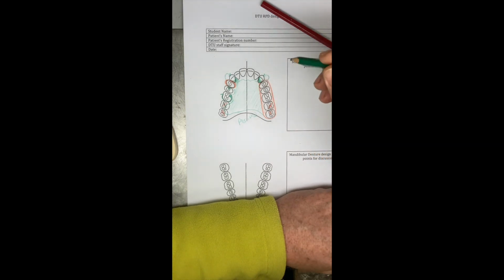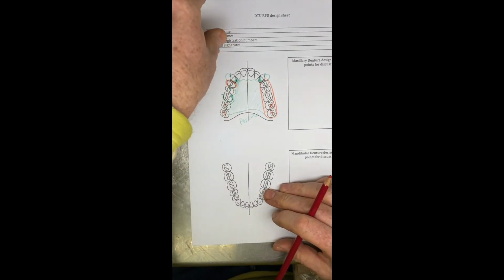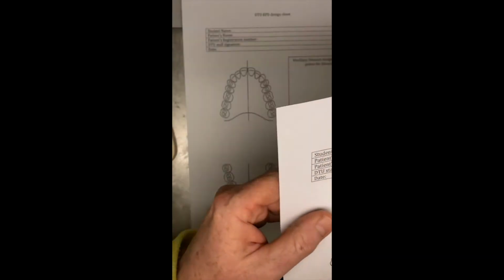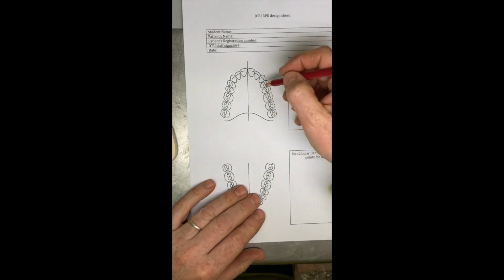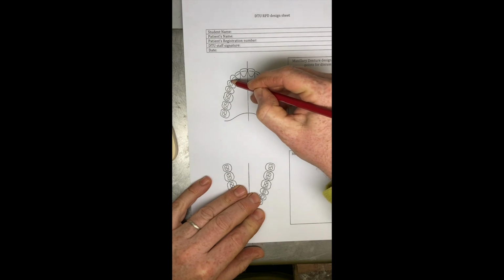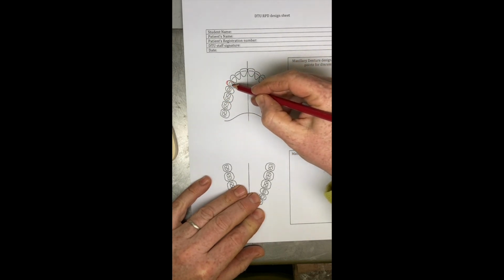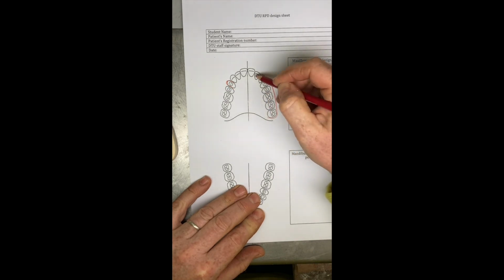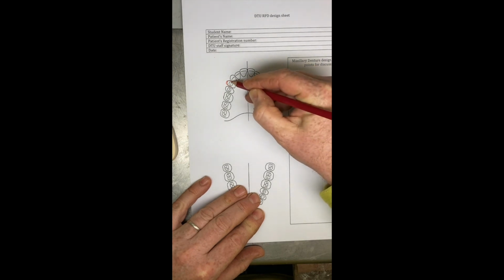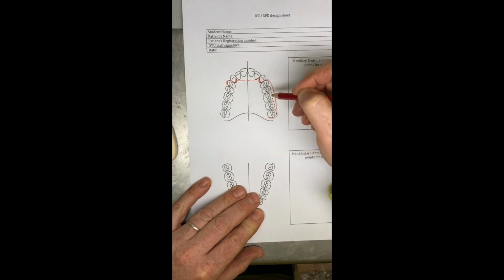Okay, so that's number 5. If you were going to do a mucosa borne denture for model number 5, working through the same procedure again, we would have a large footprint like so. This would be our saddle area. This time the acrylic work, when we're thinking of support, wants to come up onto the abutment teeth to above the survey line, so just onto those canines, something like that.